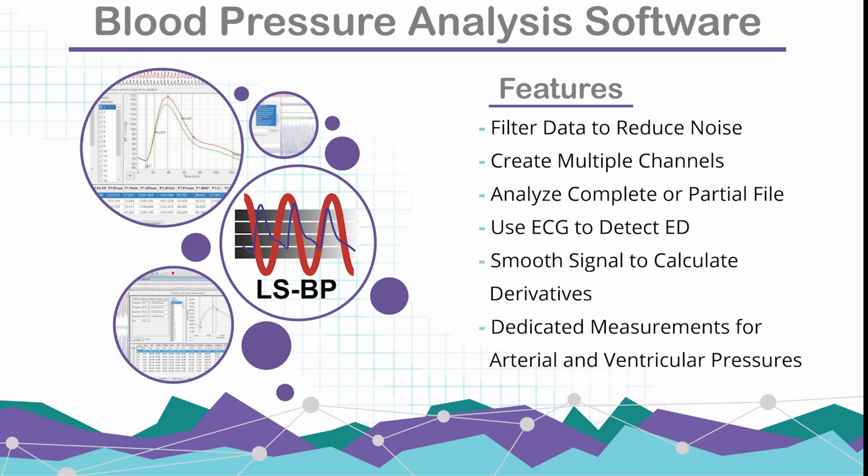You're able to analyze either a complete or a part of a data file. So say that you were just interested in the part immediately before or immediately after a drug was added. You don't have to take out that section and try to do analysis of that in a separate program. You're able to focus in right on that area that you're looking at.